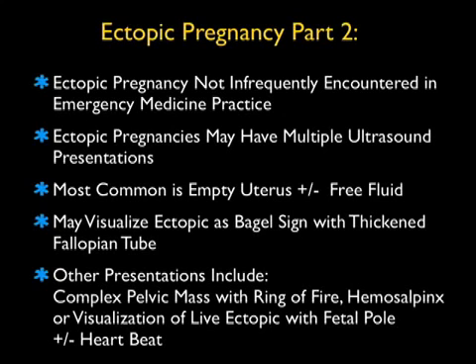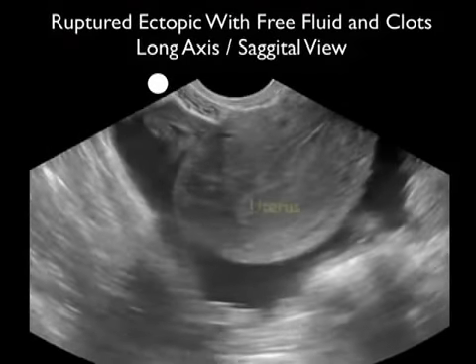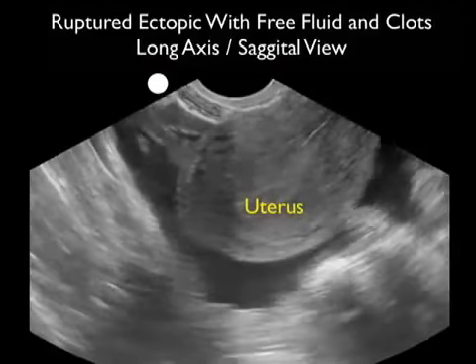We may be able to visualize the ectopic as a bagel sign, which constitutes a thickened fallopian tube. Other presentations of ectopics include a complex pelvic mass with a ring of fire on Doppler sonography, hemosalpinx or blood within the fallopian tube, or we may be able to visualize the live ectopic in the adnexa with a fetal pole and/or heartbeat.